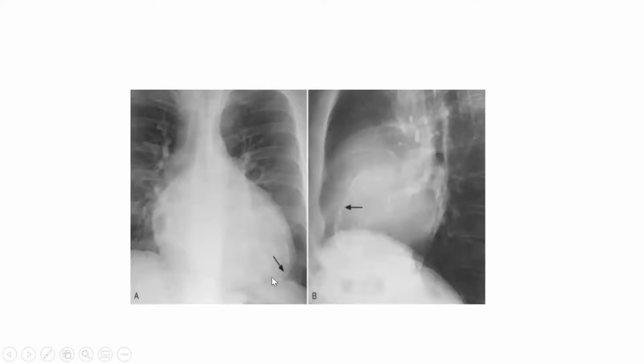Now, this is another calcification. You see it here in the PA, and you see it here in the lateral X-ray. So do you think this is pericardial calcification or something else? Is it pericardial calcification or no? Did you hear my question? Yes, I think not pericardial.